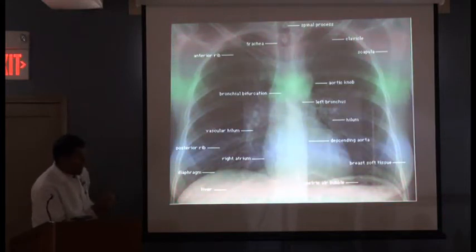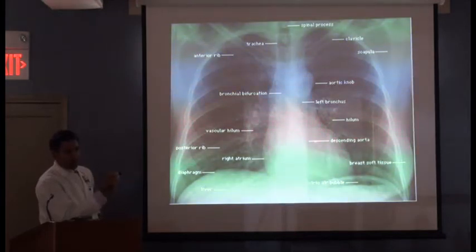The other thing we can see in the diaphragm, what if the diaphragm is really high, right? Or if we don't really see a diaphragm and we see a big stomach bubble up here. What if we see a stomach bubble up here? Doris.